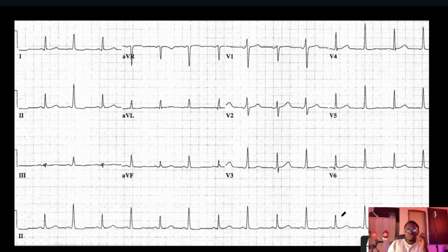All right, so summary: sinus, regular, normal cardiac axis, heart rate of about 85 beats per minute, electrical alternans, narrow QRS complex, normal P wave duration, normal PR interval duration. There is no ST elevation. I'm comparing all the STs I can find, and there is no ST elevation.